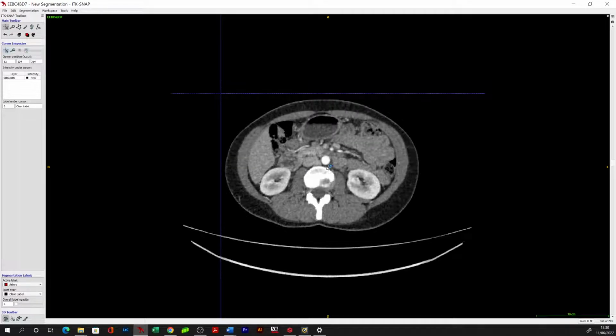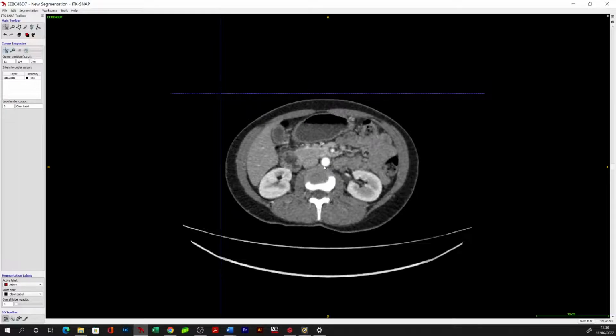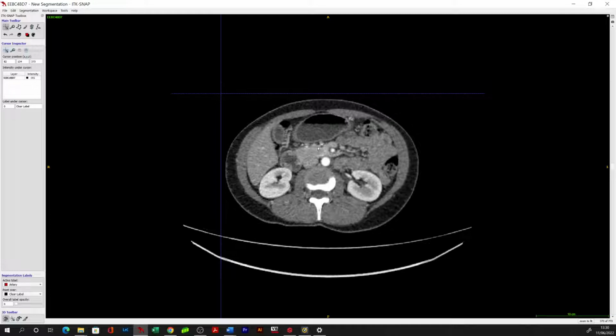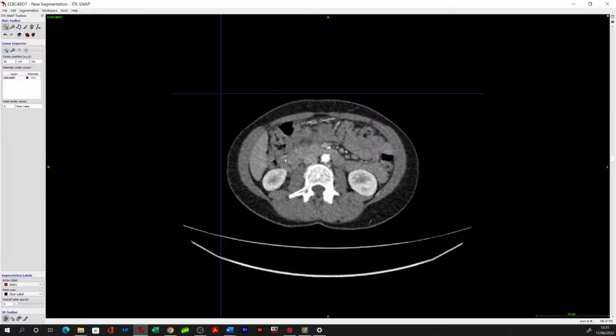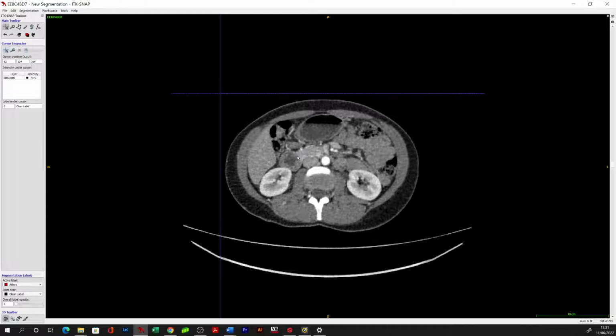Another useful tip or anatomical finding is that you will frequently see the right branch of the middle colic artery passing towards the hepatic flexure, and that can also be useful in identifying an accompanying vein, which in this situation would be the SRCV in all likelihood. So I think that there's a GEV. I think there's an SRCV.